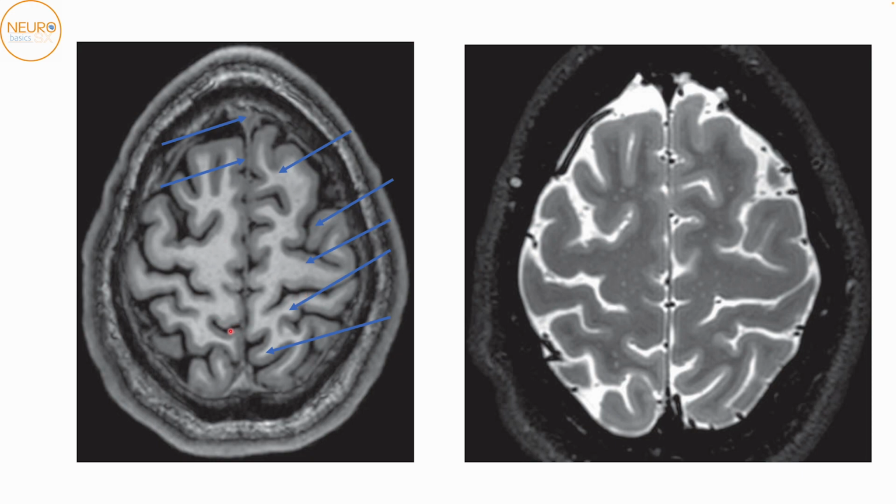Okay, so here we can see a sulcus which is reaching the midline. If this sulcus is reaching the midline, it has to be the central sulcus. Correspondingly, on the other side, this sulcus corresponds to this sulcus, so this on the other side will be the central sulcus. So far we have been able to identify the central sulcus. Using that, we can identify that this is the precentral gyrus and this is the postcentral gyrus.